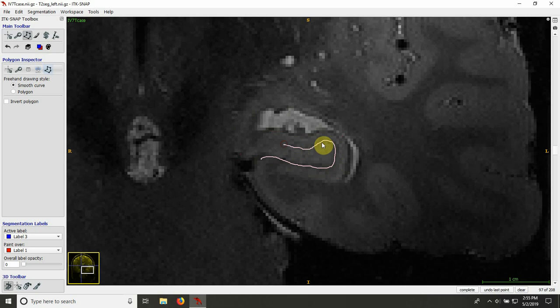And what actually helps is to also look at the outer boundary, because generally the dark band follows kind of the same curvature. And I think here actually it's not super clear, but I think this is the rest of the dark band here. You can see the alveus go inwards here, and you can see the gray matter kind of wrapping around that. So I think this is your dark band.